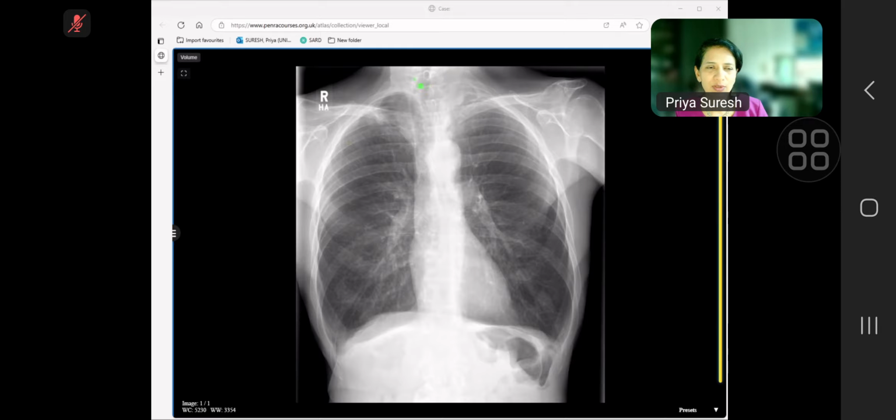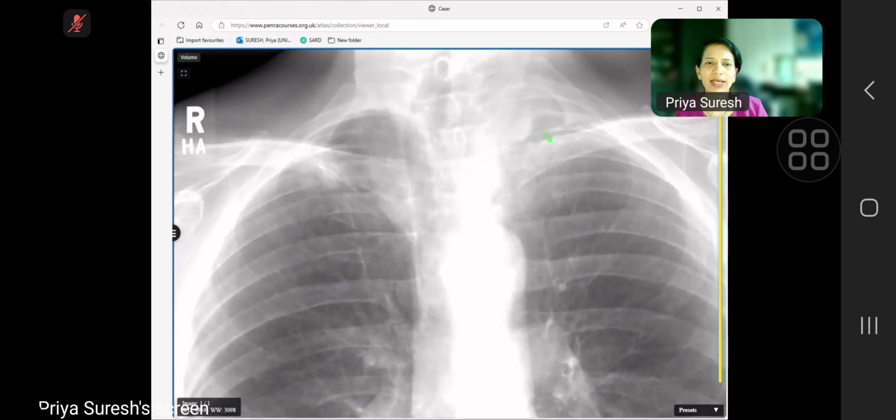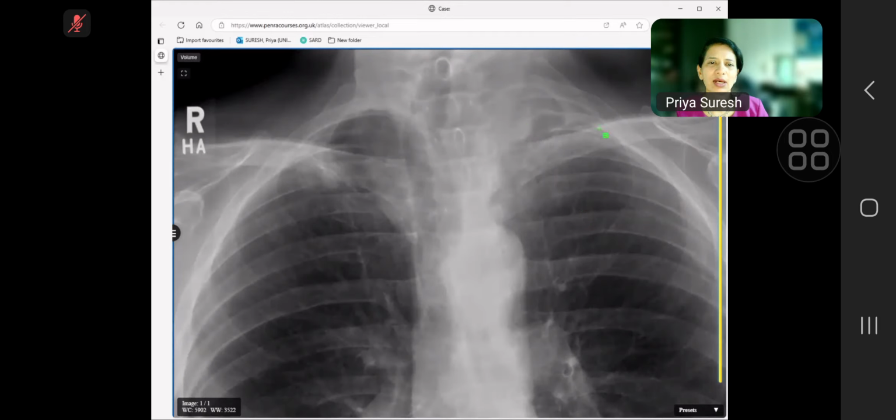The other feature that I was waiting for you to pick up is the tracheal deviation. Okay, so on the CT you picked it up, very nice, tracheal deviation, big mass. You did pick up that there is rib destruction, but you can also see that the spinous and transverse processes are hazy, not well defined, and it's gone into the canal, as you could see in the MR.